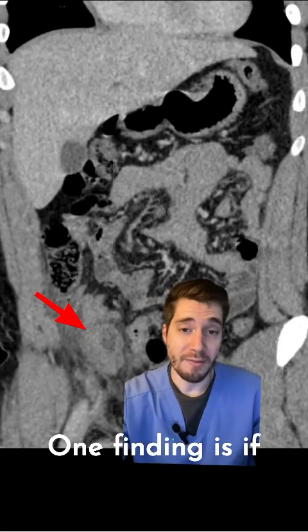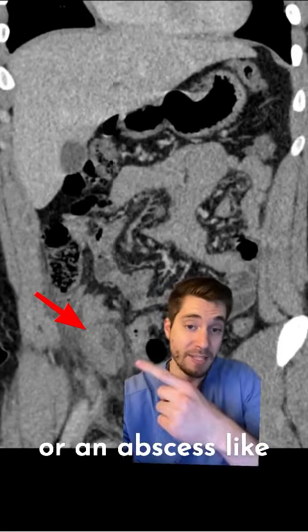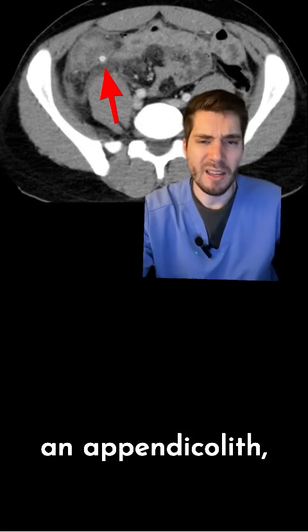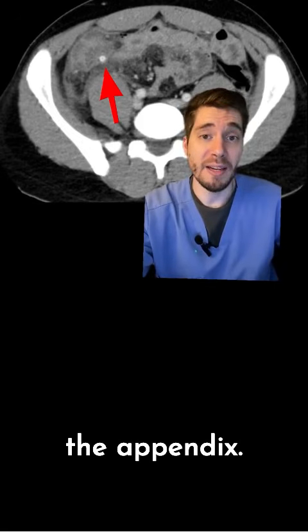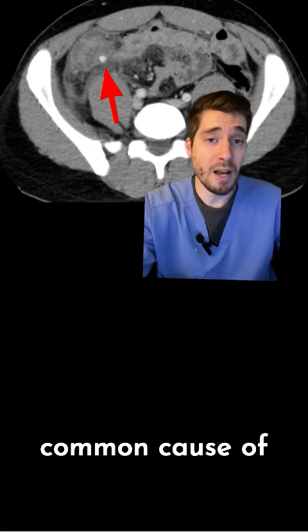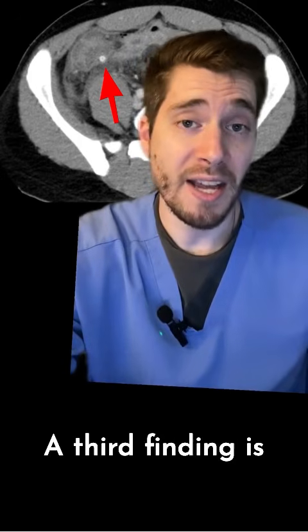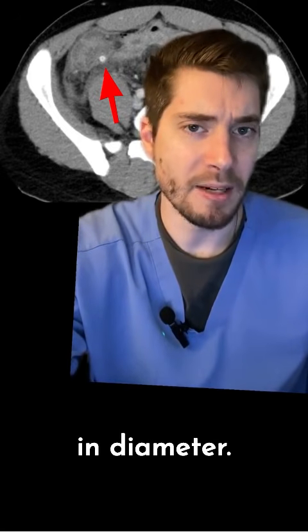One finding is if the appendix has become gangrenous and perforated, creating free air or an abscess like in this patient. Another finding is if the patient has an appendicolith, essentially a calcified mass of fecal material that's obstructing the appendix. A fecolith is a common cause of appendicitis and worth looking for on every study. A third finding is if the appendix is massively dilated, like over 13 millimeters in diameter.